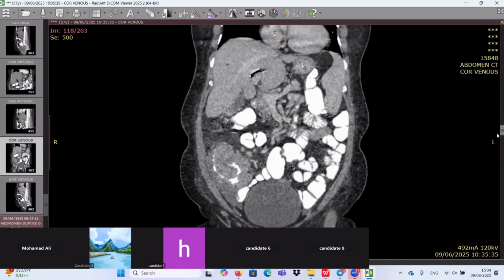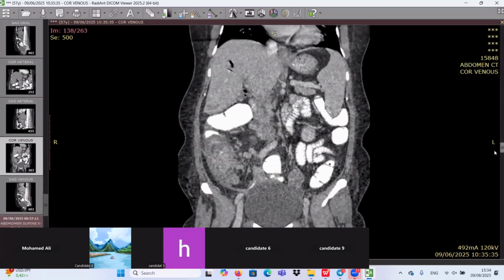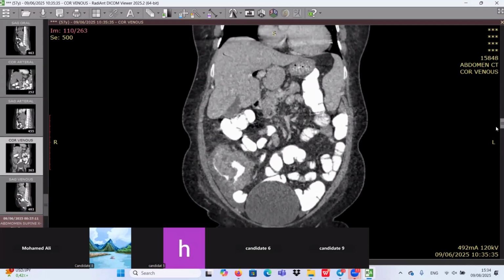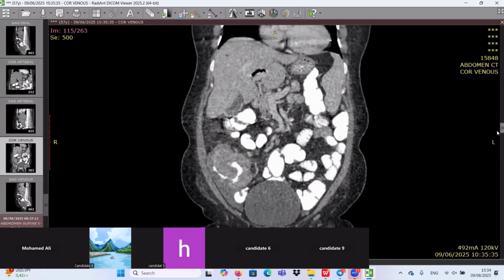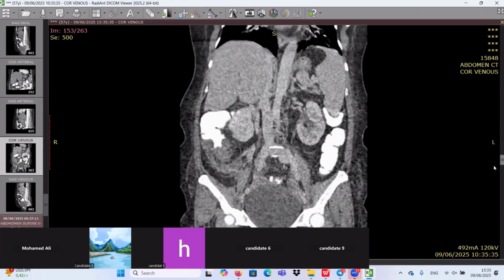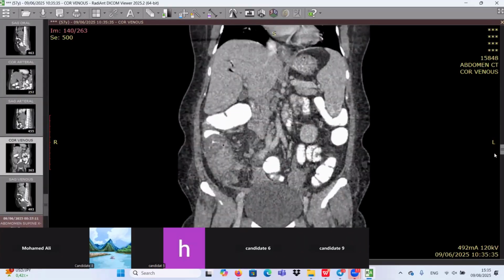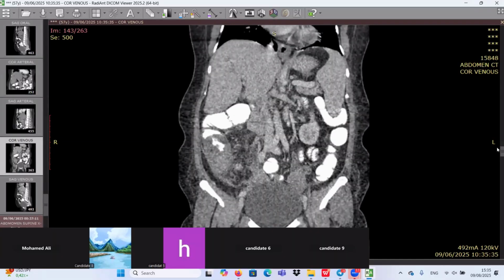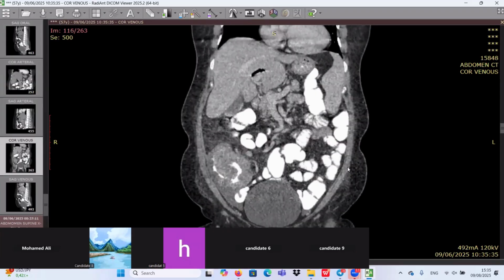However, lymphoma is not as common in the large bowel. I would put it in the differential. If it's neoplastic, because it's a long segment, we can put lymphoma in the differential, as there is still preservation of the lumen. But I would like to add something here, because the normal stratification of the bowel wall is lost.